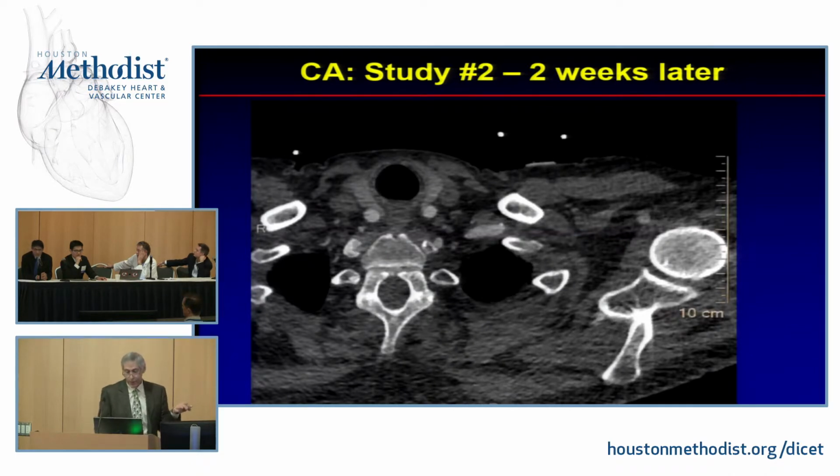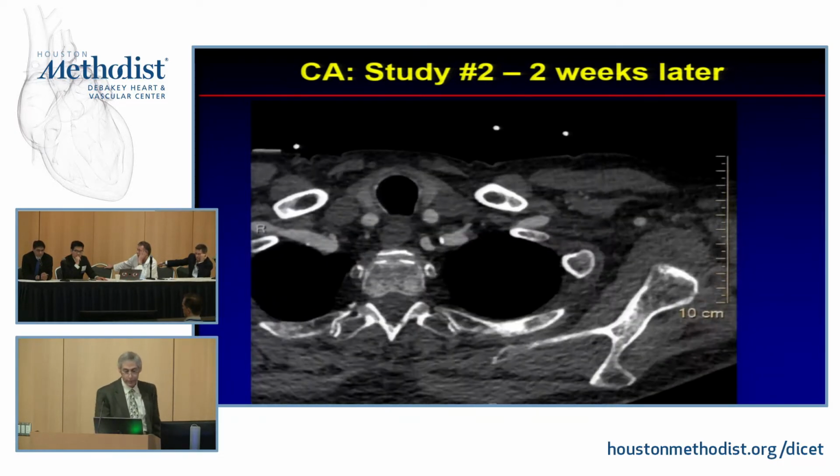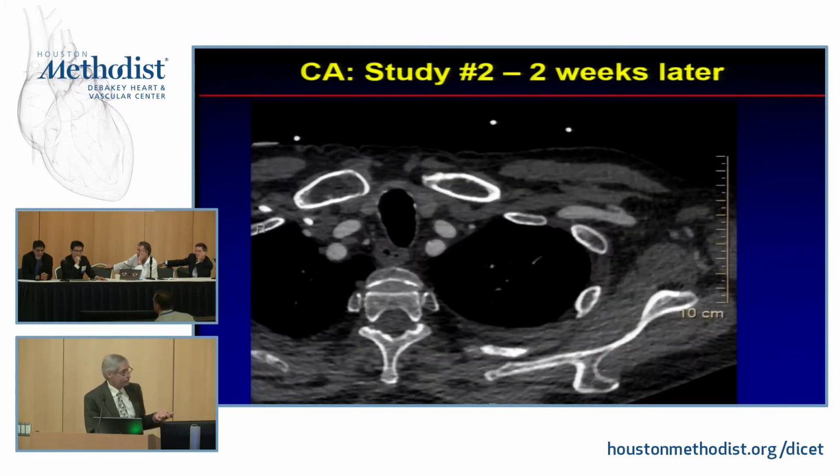How early post-op or late post-op? Oh, this is post-op like several years. This is long out. It's not early post-op. But now let's look. This is now 2 weeks later.